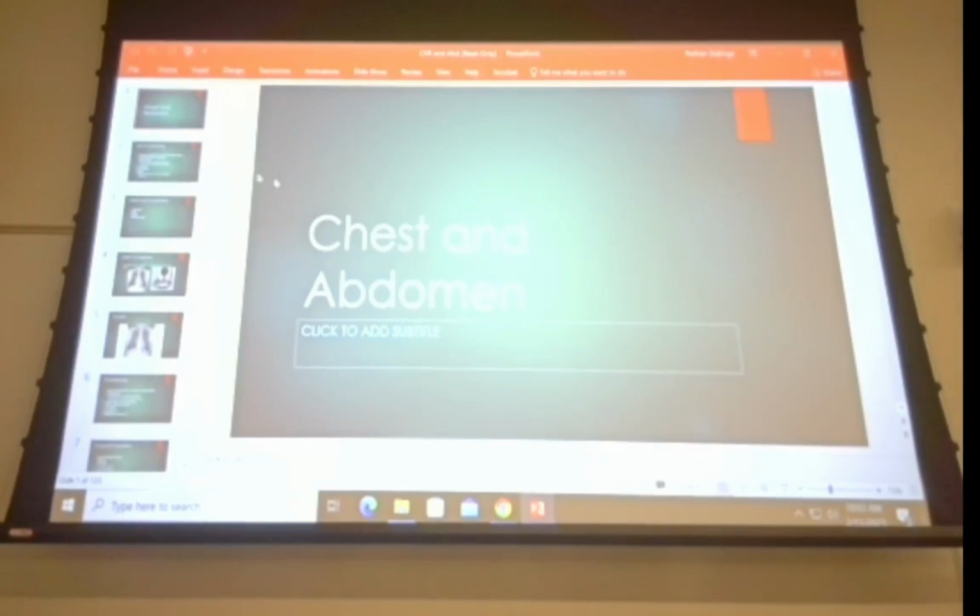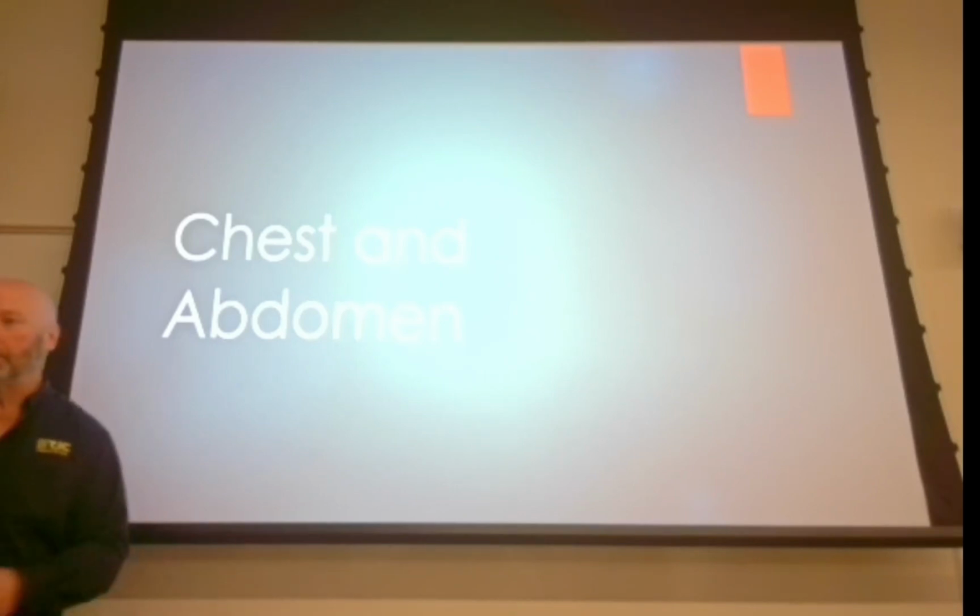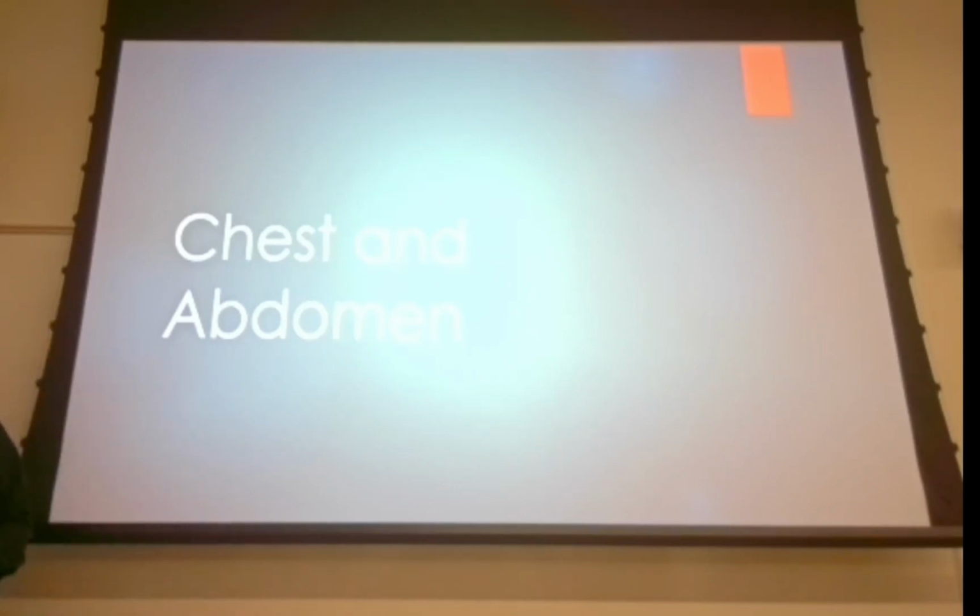least PA and lateral chest x-ray, get the most important views out of the way and talk about what to look for in your image before you repeat it. An awful lot of what we're going to be talking about is ideal images, what an ideal image looks like. Just because something's not positioned perfectly does not necessarily mean it's a repeat, which you should know by now.